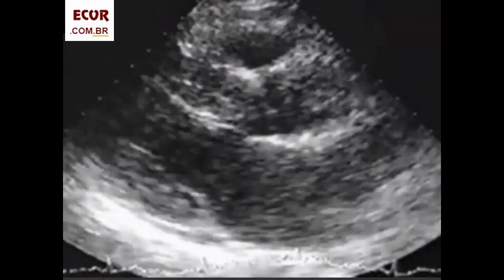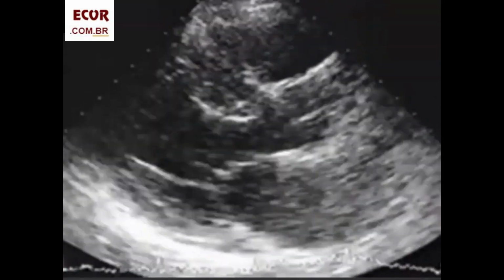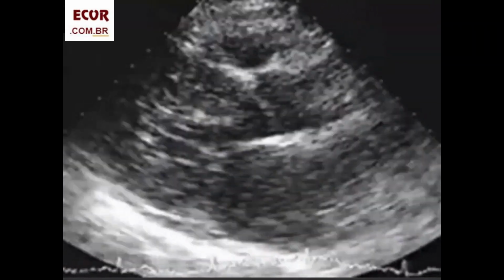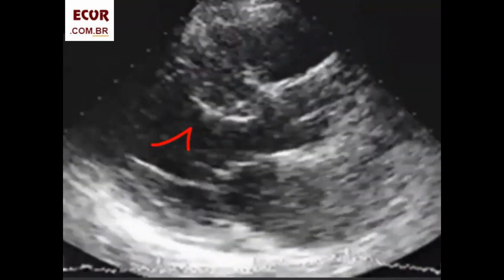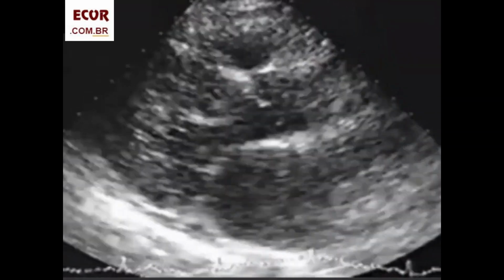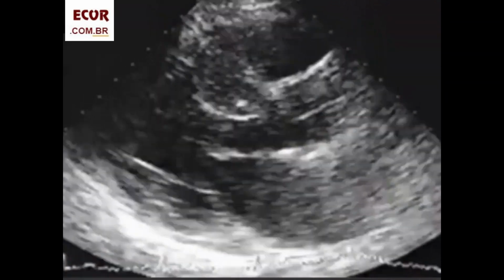But this case is much more interesting since it has an endocardial thickening, and although there was some aortic gradient, there was no angulation of the mitral valve and no contact of the leaflet with the IVS. We see that the hypertrophied IVS enters and obstructs the left ventricular outflow tract and meets the chord.